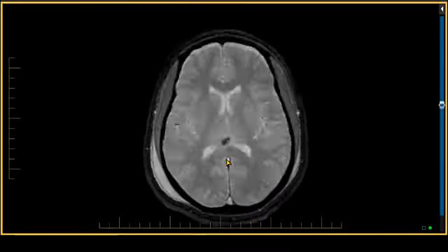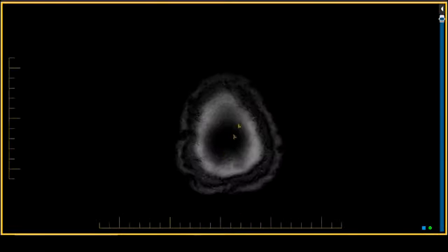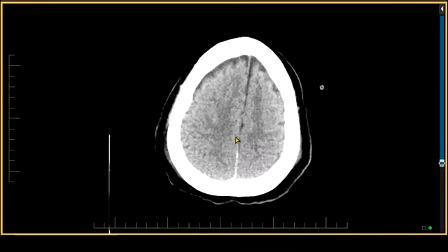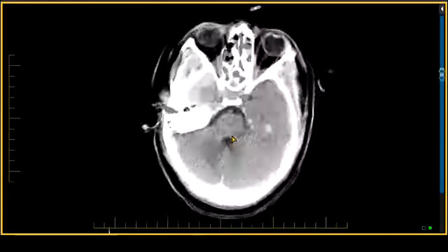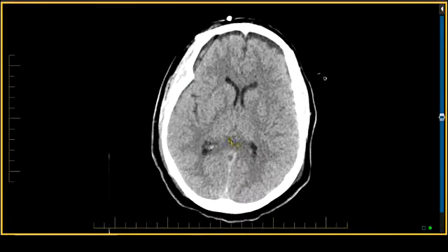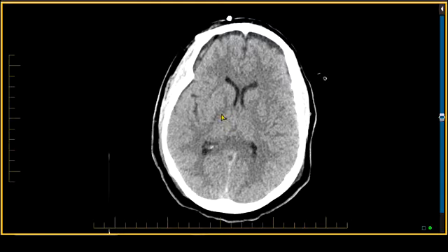So this is another example of a patient who did not do well and was subsequently shown to have a much more extensive degree of injury from diffuse axonal injury demonstrated on the MRI scan. There's one more scan that was performed 4 days after the MRI scan, and as you can see, the CT just will totally underestimate the degree of damage that has occurred. You had the CT scan beforehand, you had the CT scan after, and they just look like relatively mild injury when we know that there has been a devastating injury at the gray-white junction.